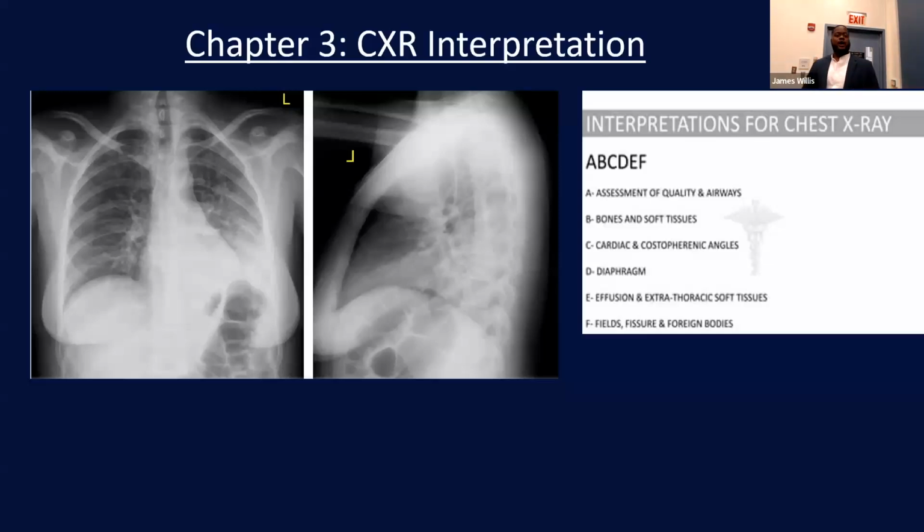Sorry, y'all. So there's different mnemonics for actually analyzing chest X-rays, right? There's different ABC models. For this specifically, I'm gonna ask for some interaction. All right, so it's gonna be interactive. So can someone tell me the A? Airway. Cool. Is the trachea midline? Is it shifted? It's midline? Phenomenal, thank you. Can someone tell me the B?